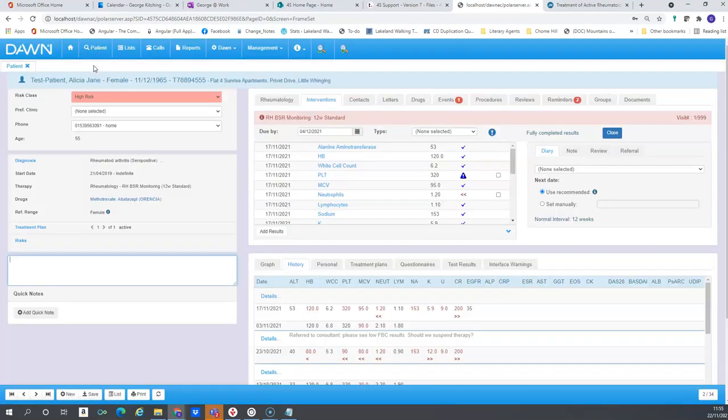But it might be that this particular patient, when it comes to hemoglobin, is regularly low. So in her case, a result of 110 is normal for her, and I don't want that flagging. I perhaps want test results flagging for this patient only if they drop below 105. In this case, it's not a reference range I need. I may still need the reference range for some of the other test results, but I need to create a patient-specific limit, something that only applies to this patient.